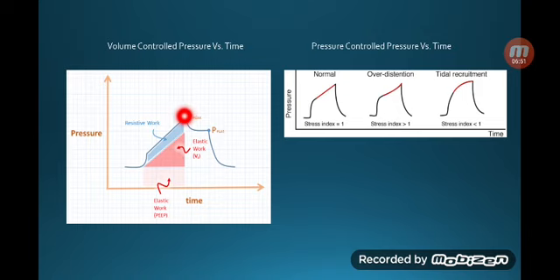But after that shot, the amount of pressure needed to get to that volume and keep it in for the inspiration time is usually less than the push against resistance to inflate the lung.